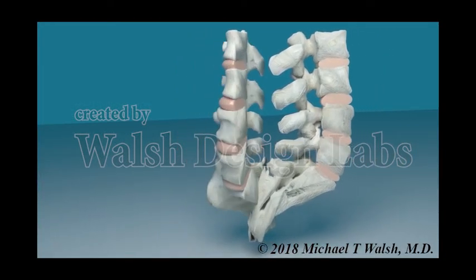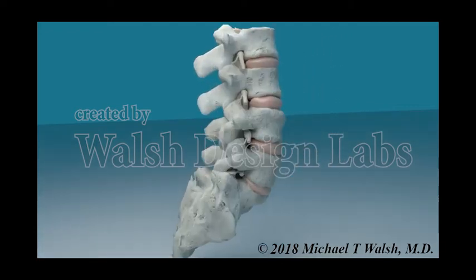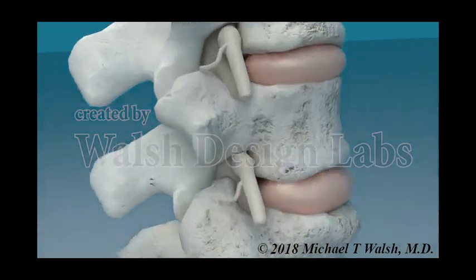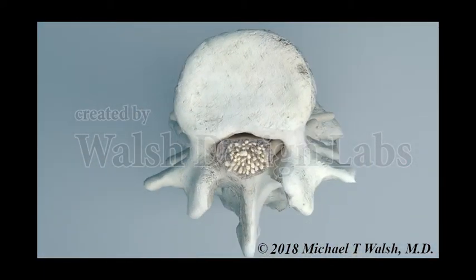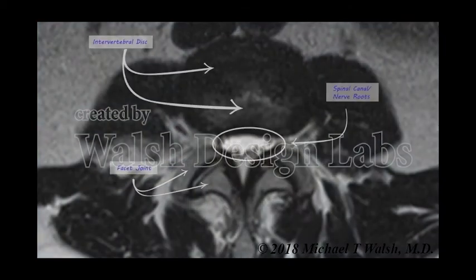Today we will likely scroll through your MRI as part of your visit. However, I don't only like to look at one view of the MRI. I've found that the down the barrel view, so to speak, is also very useful. This can give me a really good sense of what the nerve roots look like in the spinal canal, as well as how much room there is, and what structures, if any, might be putting your nerves at risk.